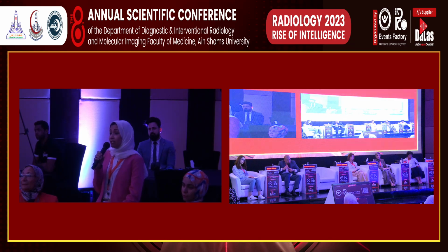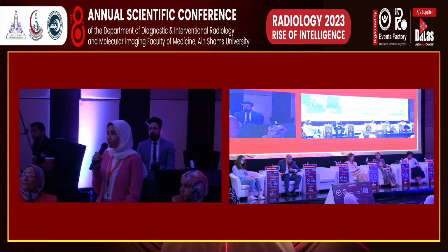فده بيقول لي انه لا المكان دوت سسبيشس، انا عندي هنا ليجن فعلا حقيقي، حتى لو انا بقى فشلت اني اشوفه في السي تي ومش واضح حلو، لا انا عندي هنا ليجن حقيقيه، والليجن دي كمان غالبا 90% نيوبلاستيك لان الاس يو في بتاعتها عماله تعلى وهي عماله تاخد التريسر بشراهه يعني.